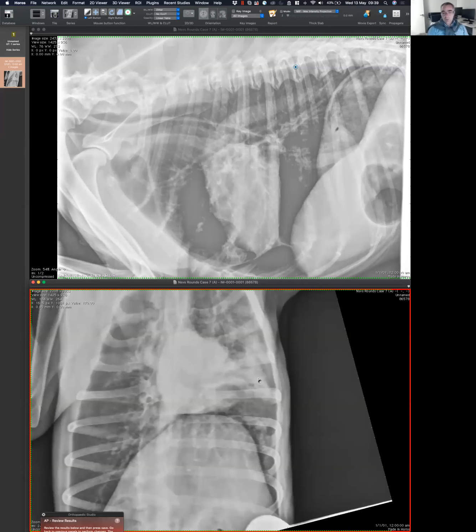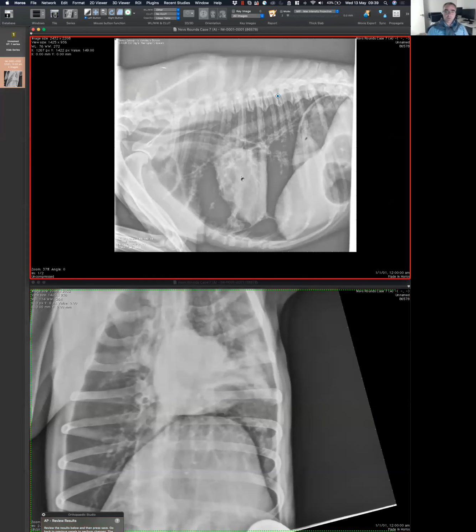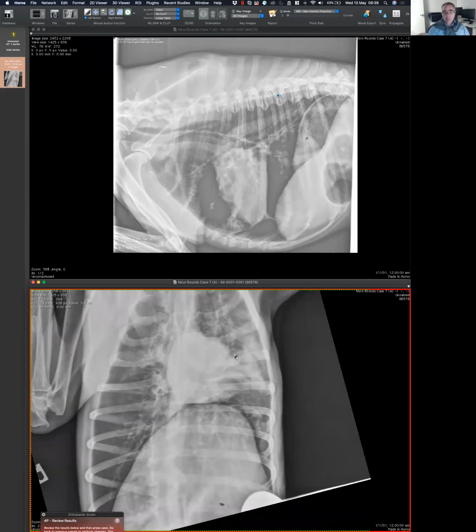Same principle to explain why we don't see vessels in this area, because the vessels are in there, but they are surrounded by fluid. So that is concerning. Based on it, I'm guessing the distribution is going to be more ventral. I don't know because I would like to see that in this radiograph. But in my eyes, if the dog is dyspneic, I would blame this. We are a bit limited, but assuming it has a ventral distribution, I'm going to think about pneumonia as the top differential. And having a history of an anesthesia, my top differential will be aspiration pneumonia.